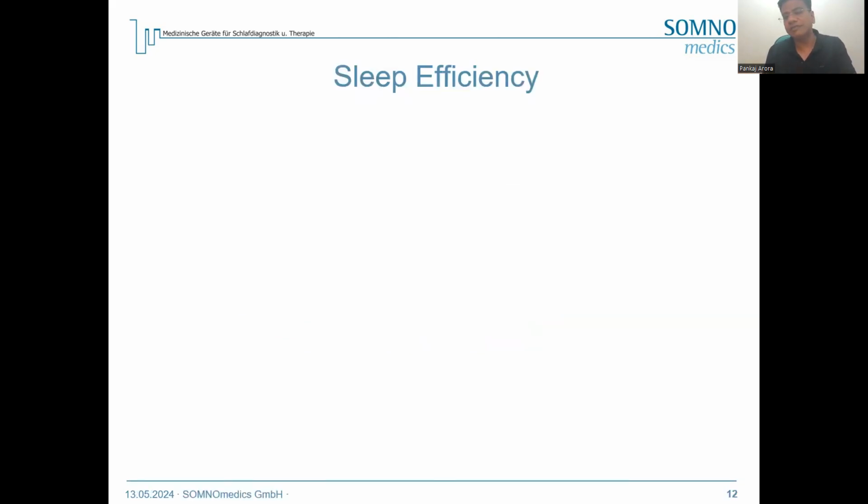I was trying to tell you about sleep latency and sleep onset, and lights off and lights on, because we are interested in sleep efficiency. So what will happen in the normal person? Sleep efficiency is 85 to 90%. But what will happen with the patient who has sleep disorder issues? They will have different sleep, and will have low sleep efficiency as compared to the normal person.